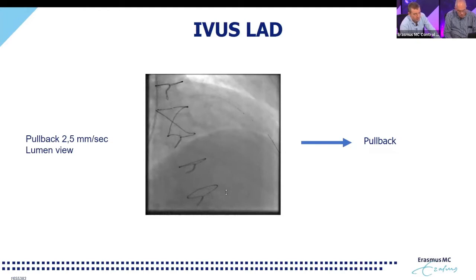But what you can never distinguish is whether this is distal embolization because of plaque protrusion that embolized distally, or whether the sluggish flow, or TIMI grade 1 flow as in this case, is due to a distal edge dissection that might also impair the distal flow and clearly warrants a different approach in terms of further treatment optimization as compared to just no reflow because of plaque protrusion. And that's where the IVUS can help. And that's also what we did in this case, to assess the potential treatable mechanisms of the no reflow. So if we go back to the IVUS.